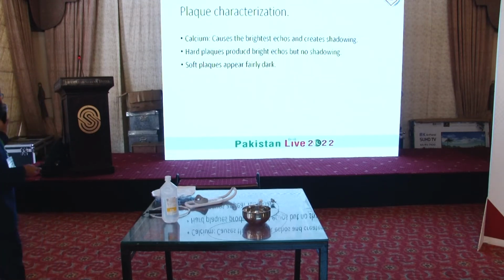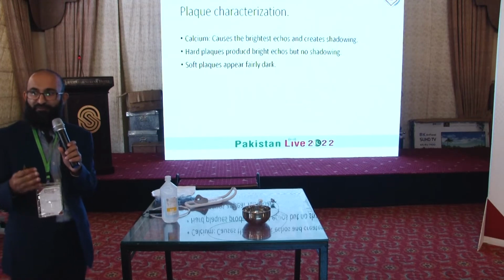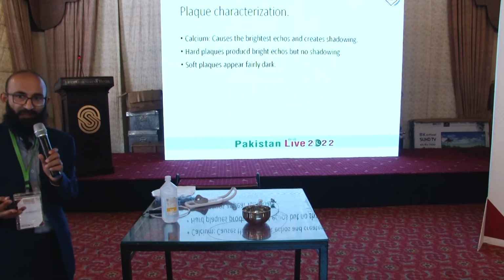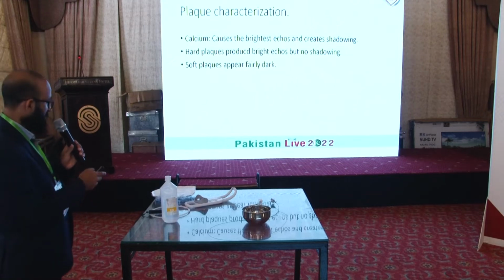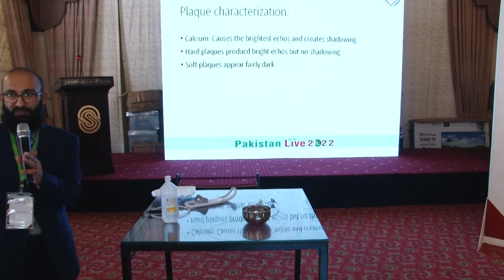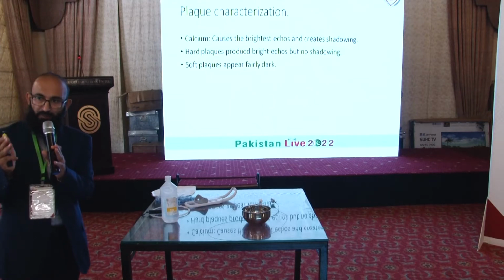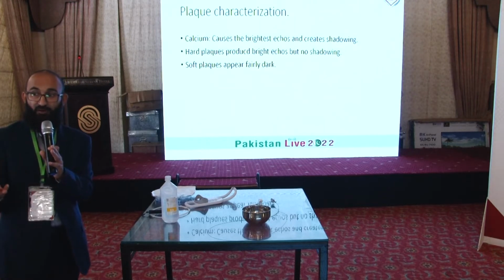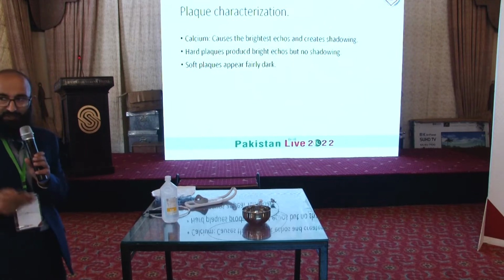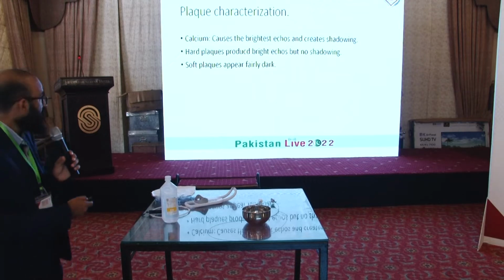Now, we can get from this image the plaque characteristics as well. Like that can be very calcific, that can be fibrotic, that can be a soft plaque. So we can get that from the IVUS. And that's very important for procedure planning, because I will show you one case: if you don't have a plaque modification, your short-term and long-term events are adversely affected, because you will have an underexpanded stent, and that will lead to stent thrombosis and ISR.